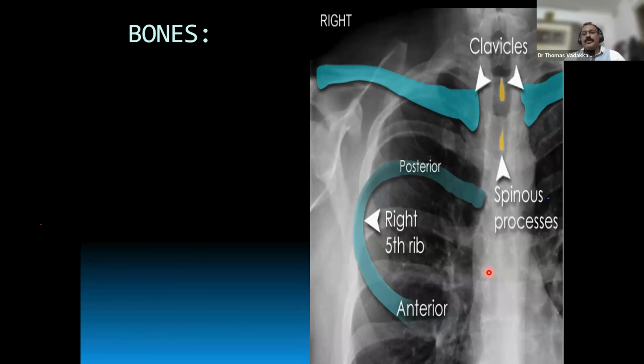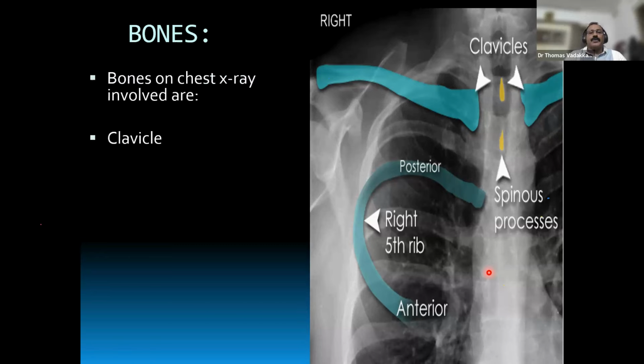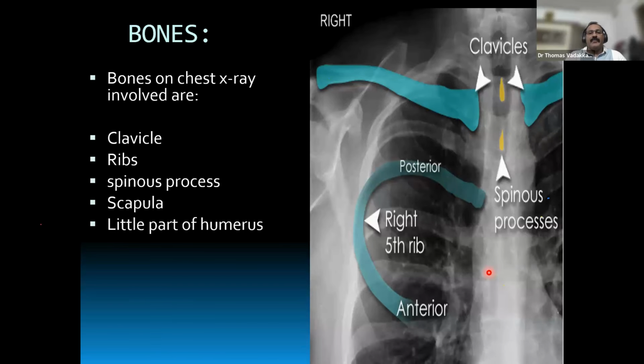Sometimes we see osteoporosis, osteoarthritis, bamboo spine, so many findings you might get, and also sometimes the lytic lesions of the metastasis as well. So bones assessment is very important. Check individual bone and look for any abnormality, record it, and correlate with the lung findings.